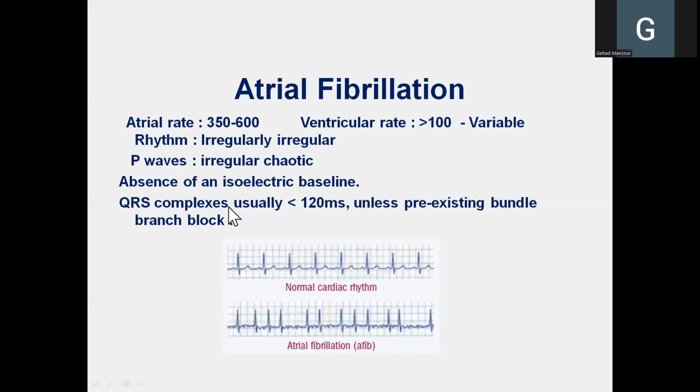The QRS complexes are usually, as we said before, the duration should be normal, less than 0.12 seconds or less than 120 milliseconds. It's the same value, 0.12 second and 120 millisecond.